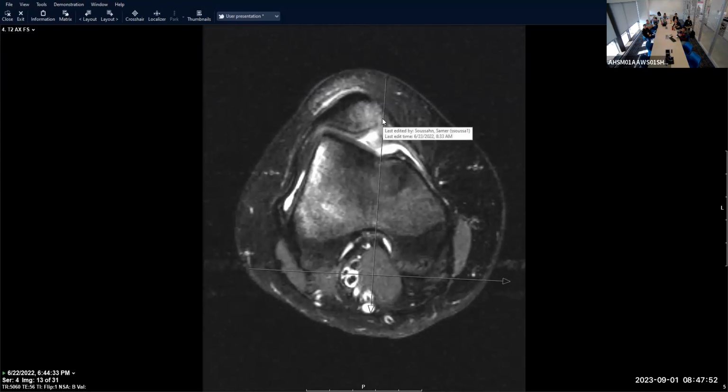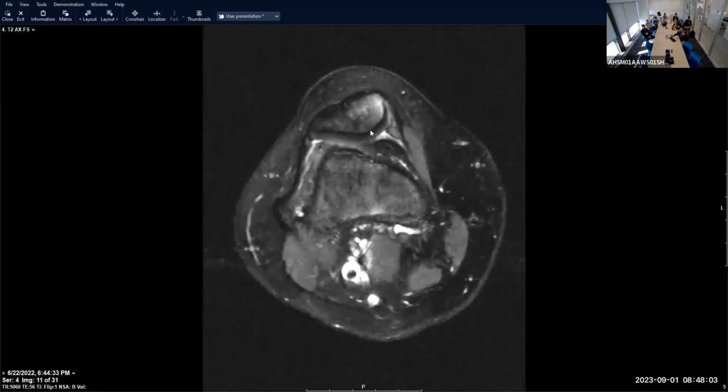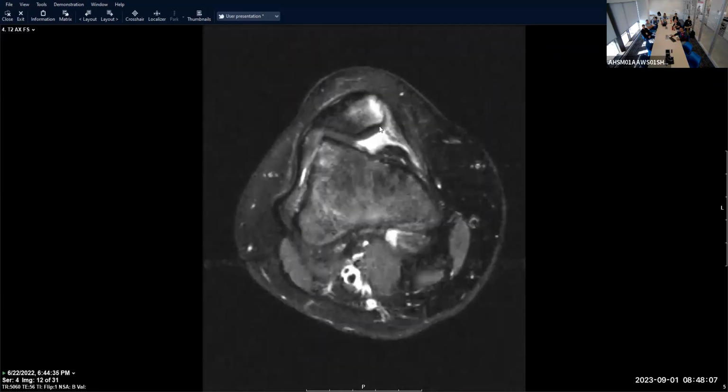Sometimes it's just blown in. You can't really say much about the cartilage. There's an osteochondral impaction fracture, but you won't see defects there because you don't really see much besides schmutz. So then I'm looking at the rest of the patellar articular cartilage, making sure nothing was sheared off that needs to be tacked back down or anything like that.